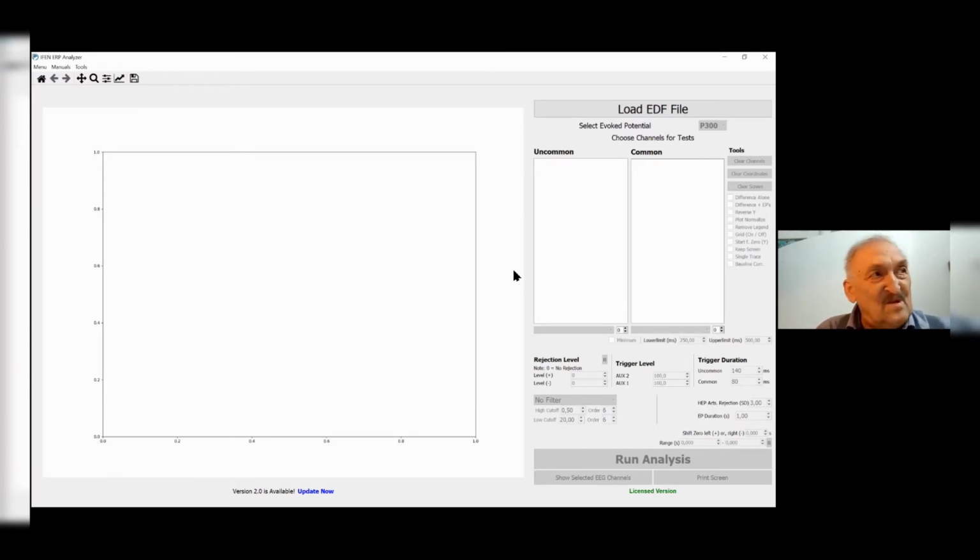The program was initially written in MATLAB, but then we transferred it to Python because there were more options we could use there. Especially, we could compile it and give it to others simply. So to show how it principally works, we only have to do a few clicks.